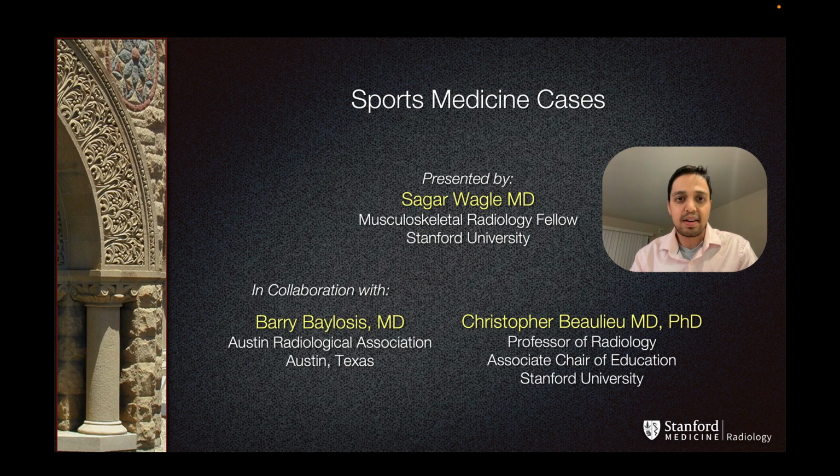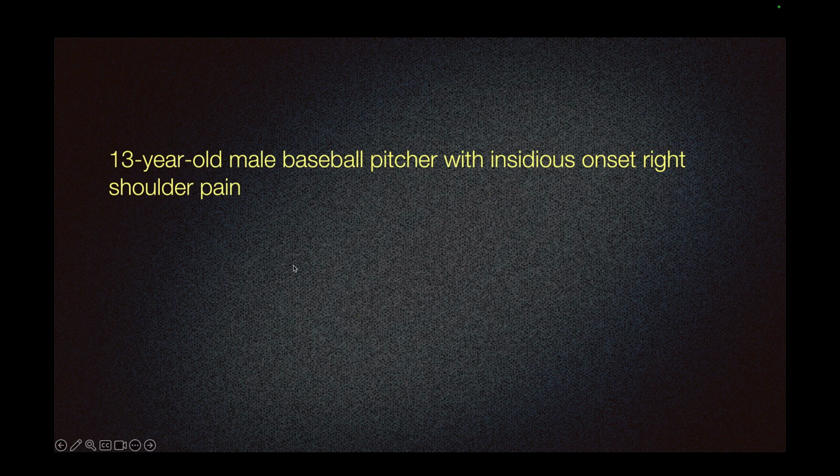Hi, this is Sagar Wagle, one of the musculoskeletal radiology fellows at Stanford University. We have a case of a 13-year-old male baseball pitcher with insidious onset right shoulder pain.